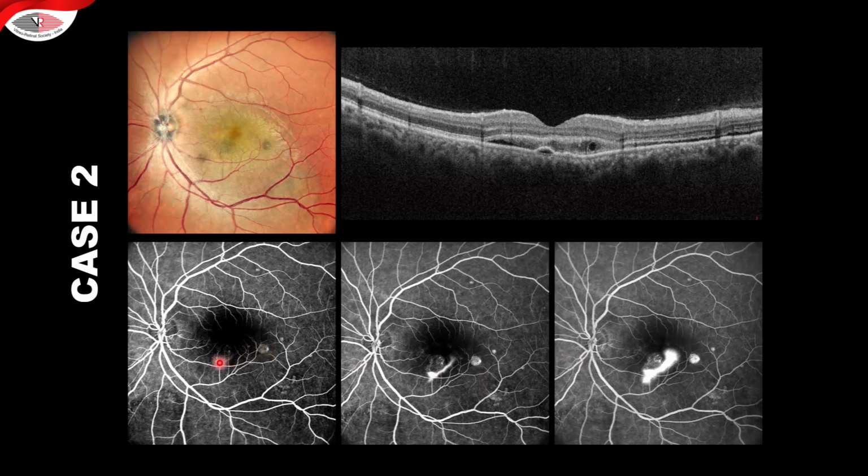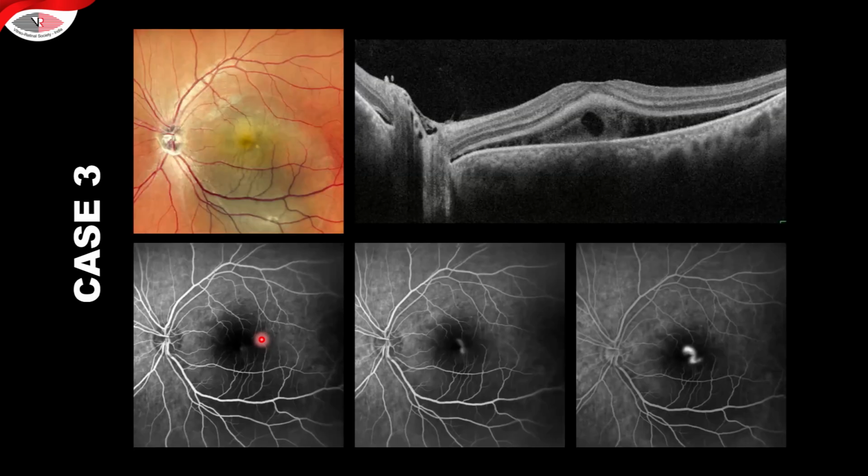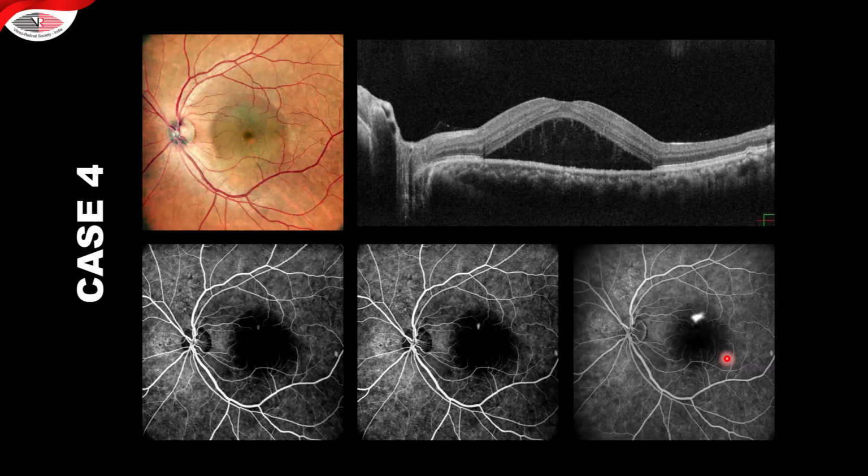It's a leak which starts below the fovea, then finds its way around temporally and goes up and expands, a typical smokestack. There's another case example, with OCT showing you a CSR, and when you do the fluorescein, a smokestack leak gradually increases almost at the foveal area. This is another example of the same.